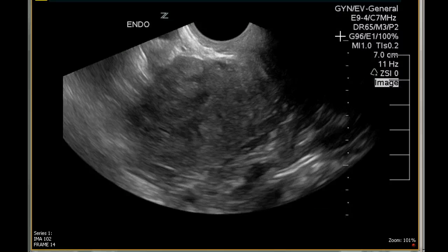She's got the 2 fibroids. Those wouldn't necessarily need any significant follow-up. So we've got the greater than 1 centimeter cyst. We're going to recommend a follow-up in 1 year. And we're going to toss the endometrial canal assessment back into the obstetrician's court to decide what they want to do, since they obviously have some more history regarding that.